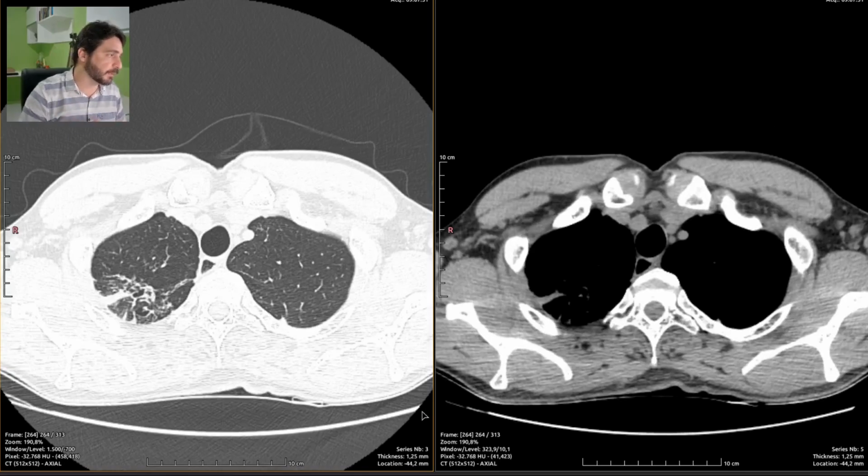So feel free to skip ahead or stay with me as I report it and mumble to myself. It's okay to go to the next case, I don't mind, but if you want to learn just a little bit more about this disease as I report it, stick around and watch as I type in this report. It's just a couple of minutes.